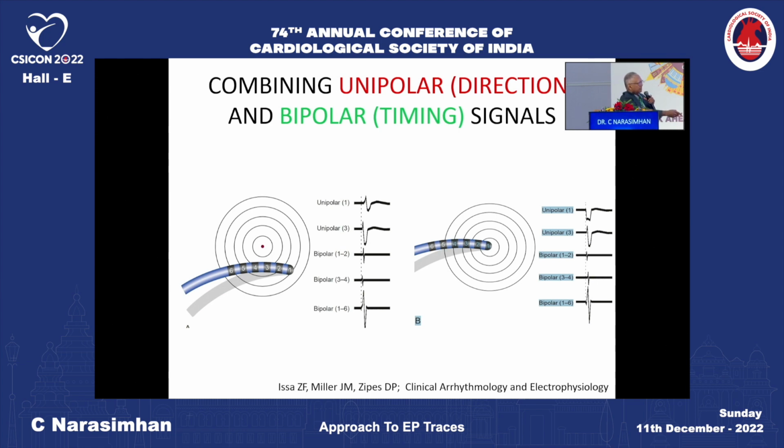Suppose you have a focus of an arrhythmia coming from here, and we have 6 electrodes here, which is recording. Suppose I take a far field view, that is a very wide view from 1 to 6. You see the earliest, this is, say for example, the QRS. In a person, the beginning of the activation starts in a global activation somewhere here.